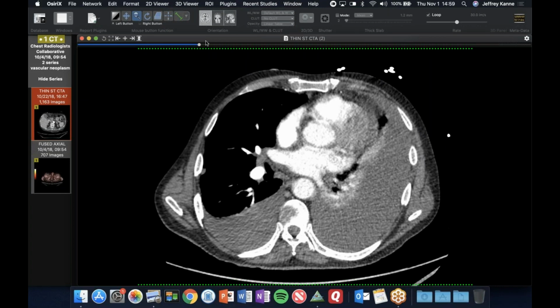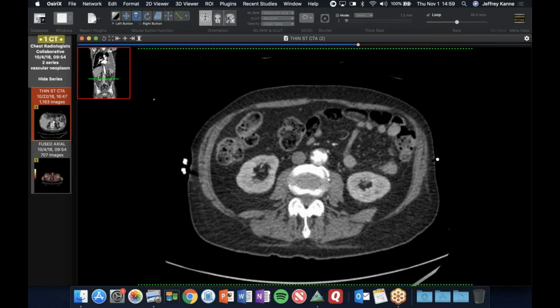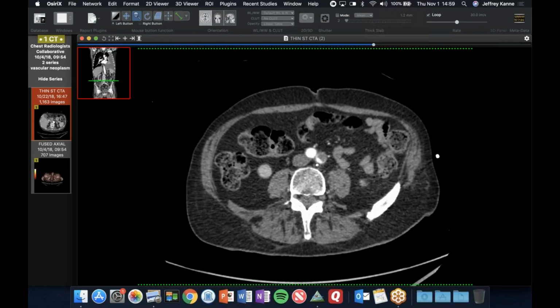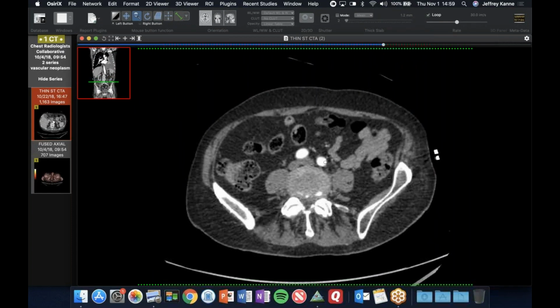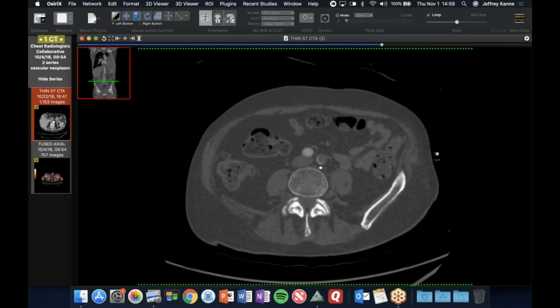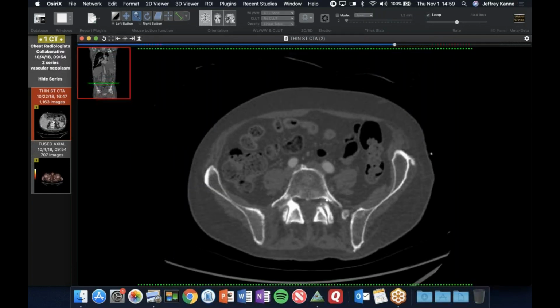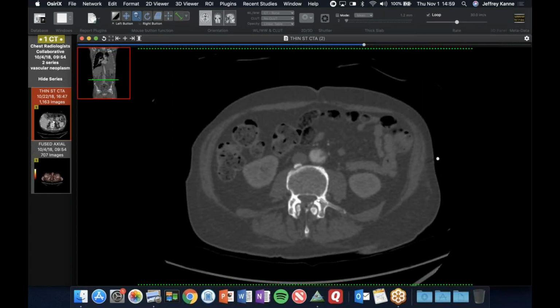Someone showed that ugly aortic case several years ago. Yeah, I had two of those I showed. Can you show it again? Sorry, I zoned out. I was looking for this yolk sac tumor case. Oh wow, yeah. So this is a mini version of your ugly aortic one. Absolutely. And then there's bone involvement too. You can see there's involvement of the bones as well, but you see that much better on the PET. I don't think you see it as well on the CT.